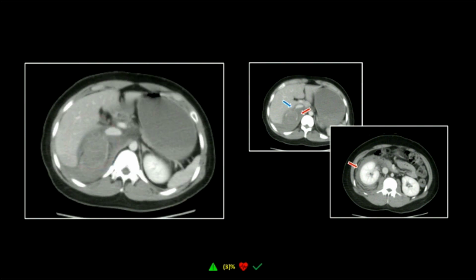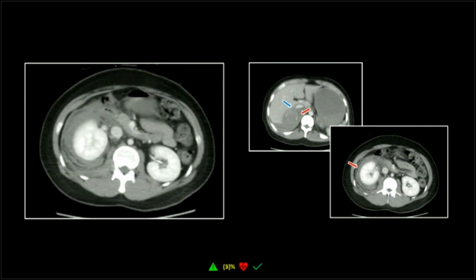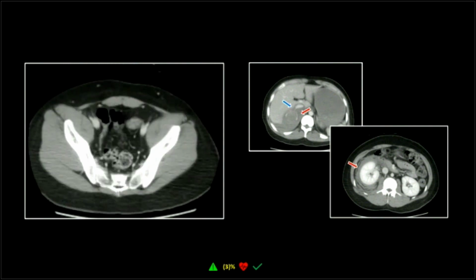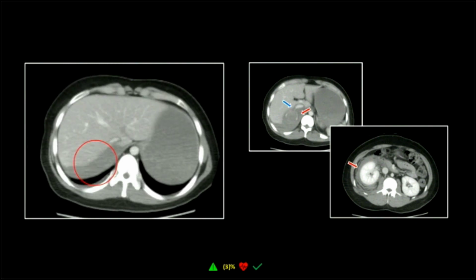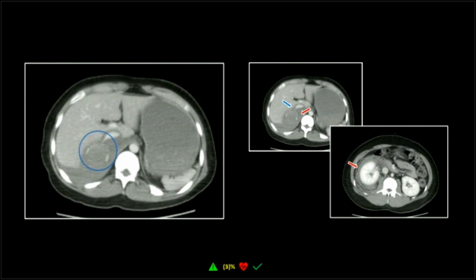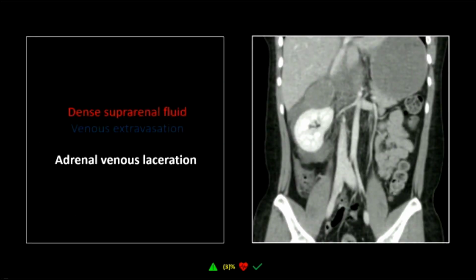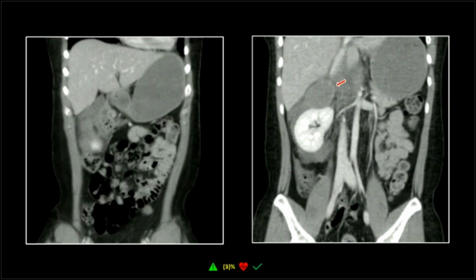This is a very large adrenal hematoma. And again, these are important to spot when they're small because they can suggest significant injury, right? An indicator of abdominal injury that should force you to do a more thorough evaluation. And it's really nice on the coronals. You can actually see it distorting the superior aspect of the right kidney.